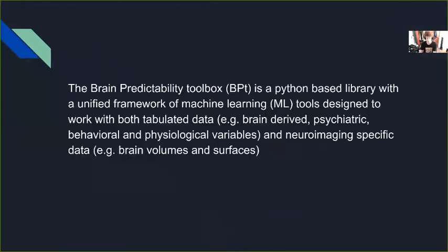Let's just hop right in. So this talk today is about a Python-based library called Brain Predictability Toolbox, or we can just call it BPT because everyone loves acronyms. And it is a unified framework of machine learning tools. So what that means is it's basically just a Python library that will hopefully provide some useful functionality for doing some types of machine learning based neuroimaging analysis that are popular in the fields, working with ROIs, which we'll do today in an example.